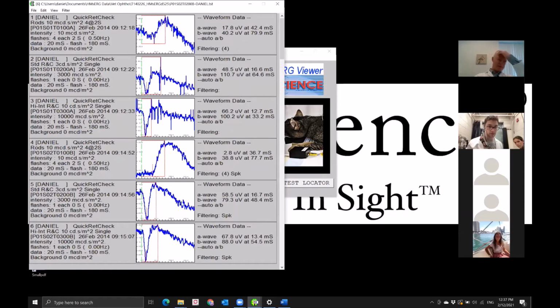So I think we're going to look at this from a difference in the time, between probably how much dark adaptation occurred on this particular animal. So they were both done at the same time, but with a couple more minutes difference in the timing. So this would be something of an example. Well, first, let's go through the process of, are the points basically being picked about the same?